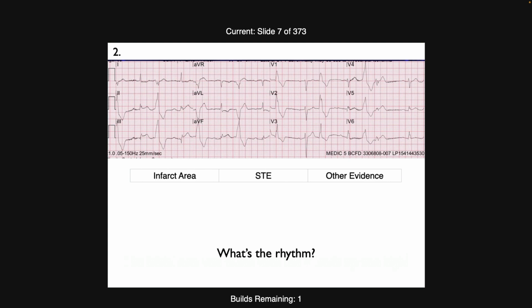If the whole thing is ventricular rhythm, for that reason. So in this case, what I would do is just circle the sinus beats, and now you can say something about what you're seeing. So is there a STEMI, and if so, where is it? I see ST elevation in inferior leads 2, 3, and aVF, and then some depression in aVL for reciprocal changes. Correct, and there appears to be something happening in V5 and V6, maybe there's some lateral, but it's really hard, the pattern changes, something goofy is happening here. So I don't feel confident from this 12 lead in talking about those lateral leads.